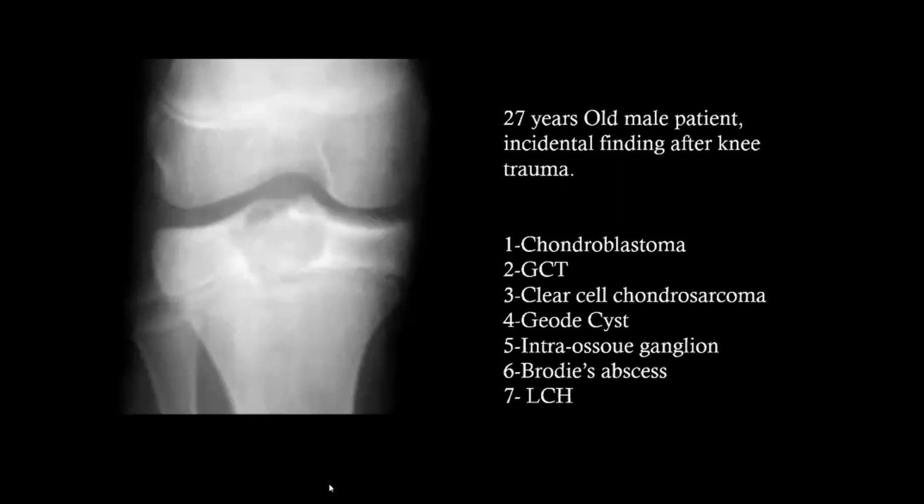Okay, great. Regarding the clear cell chondrosarcoma, it is the chondroblastoma, but in old age. That's it. Nothing else. You cannot differentiate between them by imaging. Never. It's just the age. Okay, it's chondroblastoma, epiphyseal. There is no closure of the physis, of the epiphyseal plate. So this is chondroblastoma. So surely the patient is younger than 30 years old. Okay.